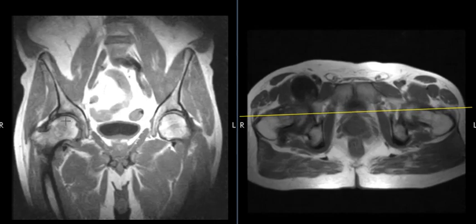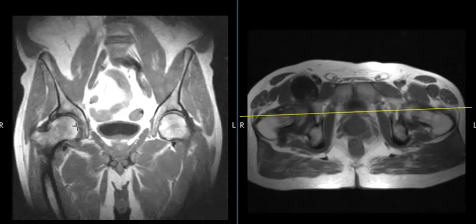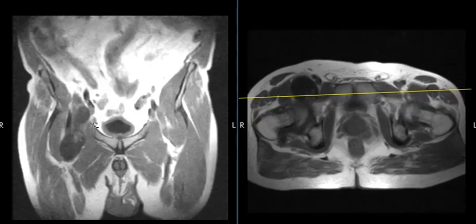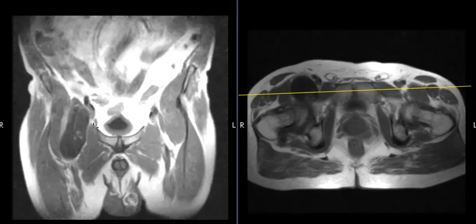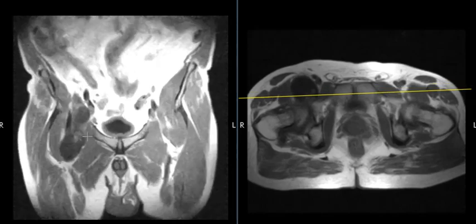You can also get marrow changes. The patient did have some marrow changes, but this was only part of the problem. The main pain was coming from something else, which was in the front of the hip. And their pain was in front, and it was related to this long, tubular-looking fluid collection. And this is an enlarged, inflamed Iliopsoas bursa. We call this Iliopsoas bursitis.